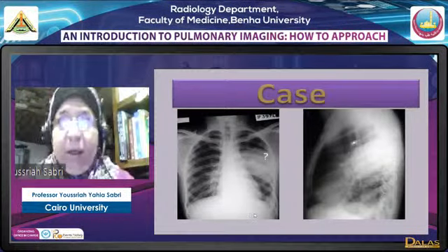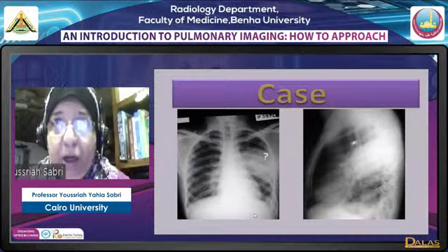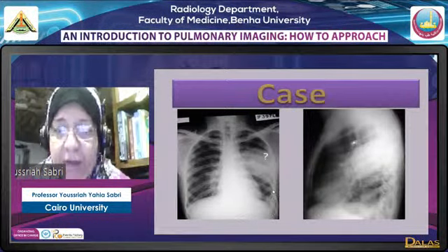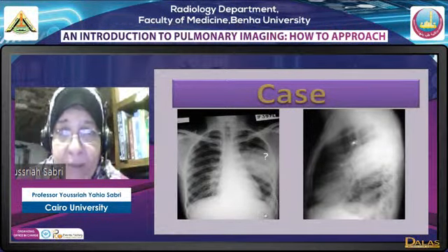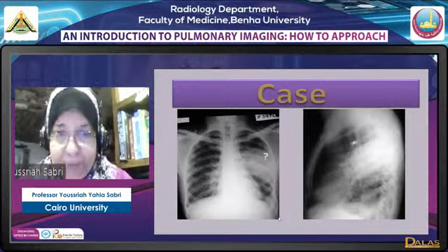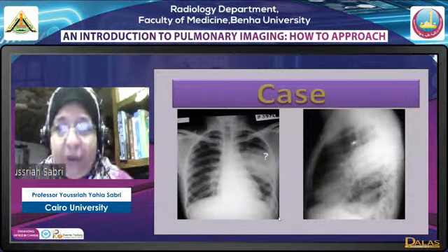These three points that we have just discussed: number one, change in configuration from PA to lateral, one ill-defined, one well-defined. Number two, having a pleural relation, which is the major fissure here. Number three, an ipsilateral pleural lesion is also visible. These three findings suggest that we are dealing with a pleural lesion, not the classic effusion and so on. This is a loculated effusion.